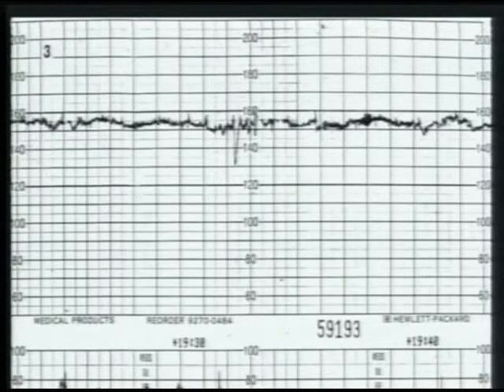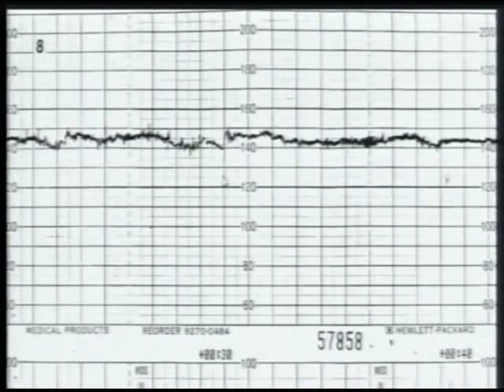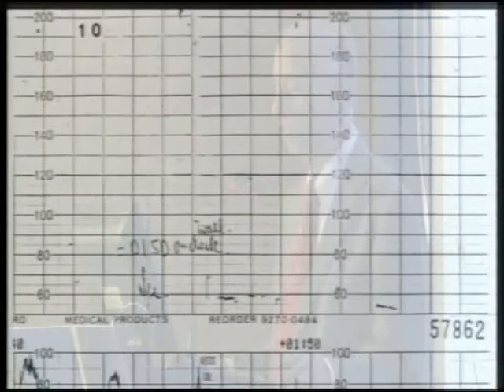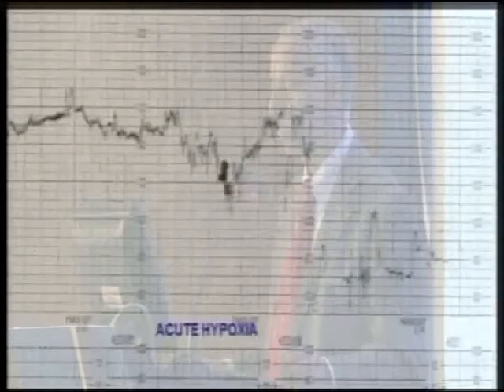And if you don't do anything, every contraction here is going to cut off the blood supply, and there won't be any change in the CTG, but the baby will get more and more acidotic, and suddenly the baby will collapse. And so this is what is happening here. At 22:30, no change, hardly any variability, past midnight, and at 1:30, suddenly the baby goes down because of severe metabolic acidosis. The baby is born here, it's a stillbirth. So one has to recognize, and these types of babies usually have telltale signs clinically, like bleeding, infection, meconium, absent fetal movements, and so forth.